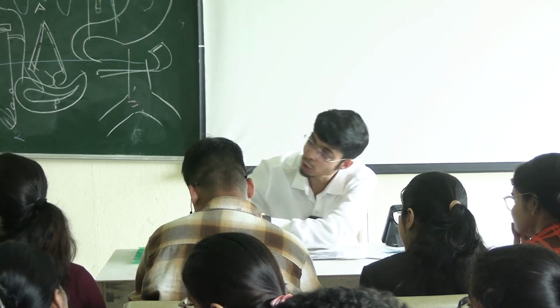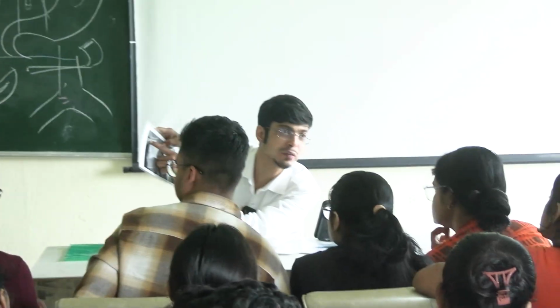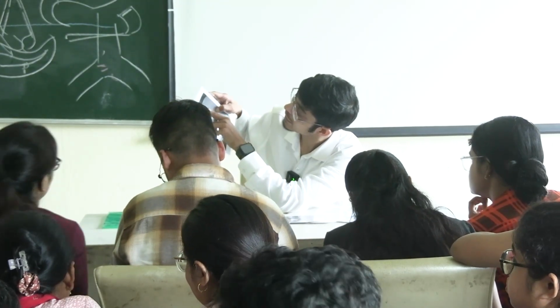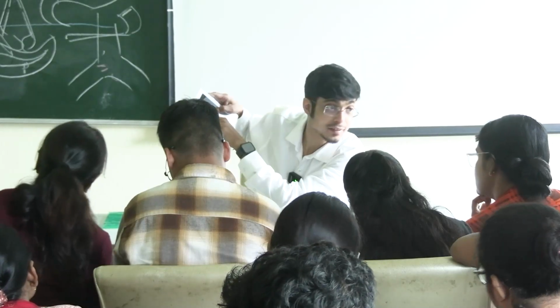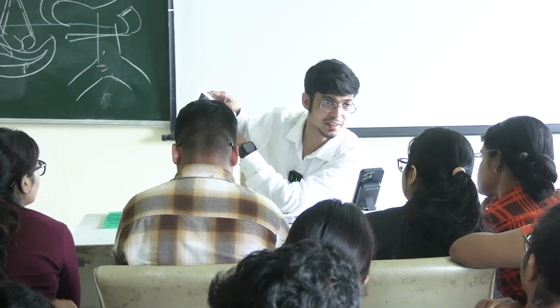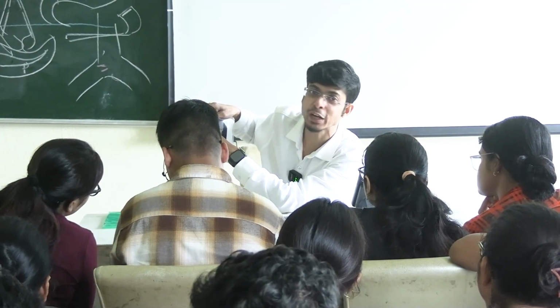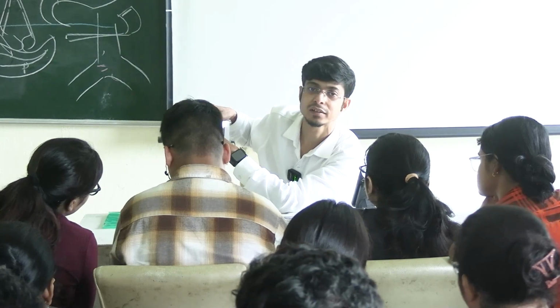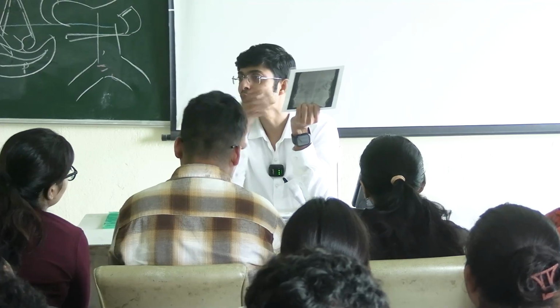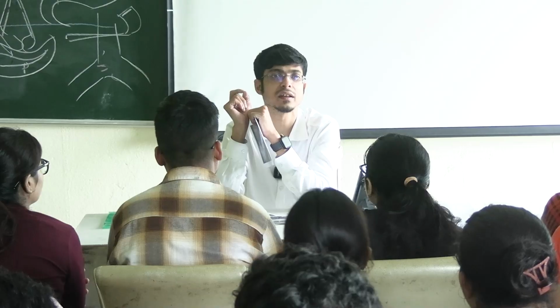তো এখানে এটা, so what you do is when seeing an X-ray, you follow the outline, follow the contour. That only will give you the exact impression of the bone. তুই যাচ্ছিস এখানে গিয়ে দেখি ছোট ছোট দুটো তিনটে টুকরো হয়ে গেছে, বুঝতে পারছিস? So nasal bone is projected like this. When there is a fracture, there will be small bony fragments outside the main outline. পরের দিনও হলো ভালো করে দেখবি এক্সরেটা। Contour, when you see an X-ray, always try to follow the contours. That is the most important thing in an X-ray.